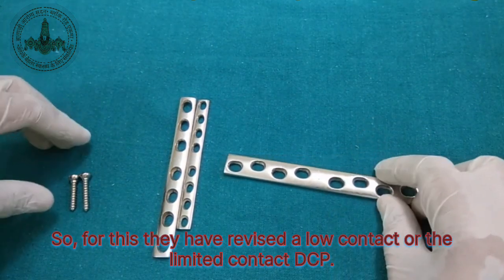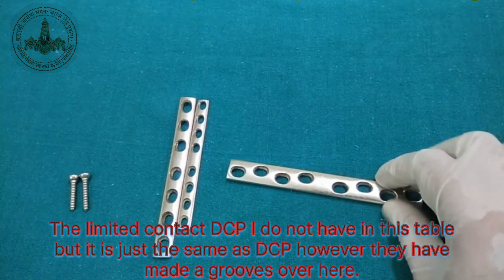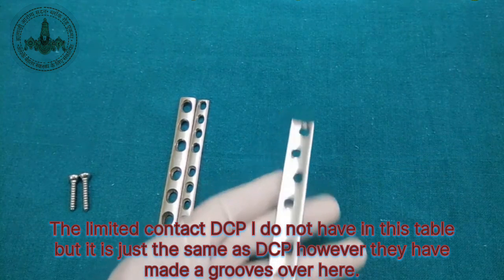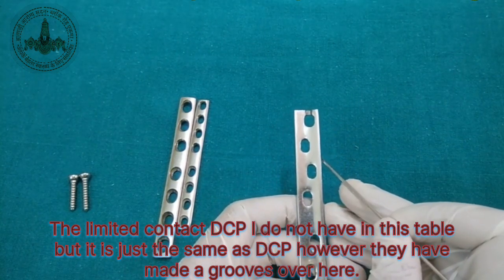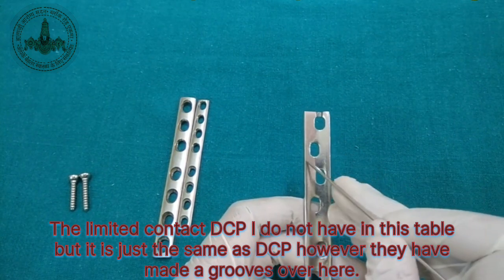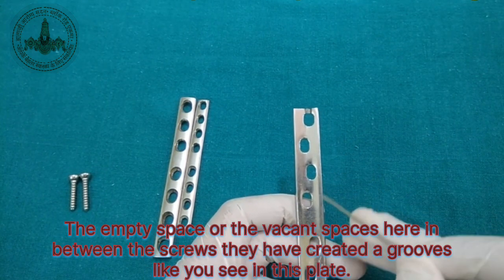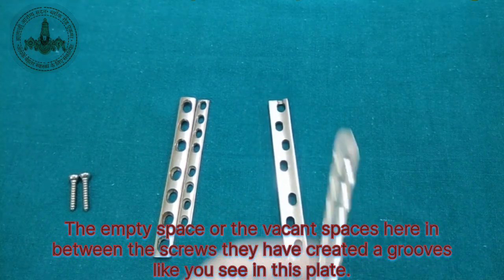So for this, they have devised a low contact or limited contact DCP. The limited contact DCP, I do not have on this table, but it is just the same as the DCP. However, they have made grooves over here. In the empty or vacant spaces between the screws, they have created grooves like you see in this plate.